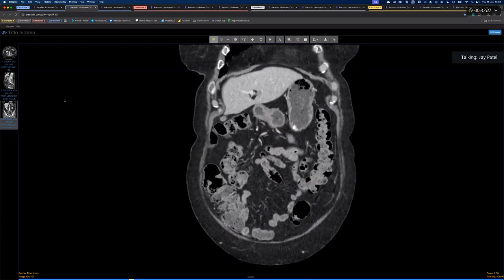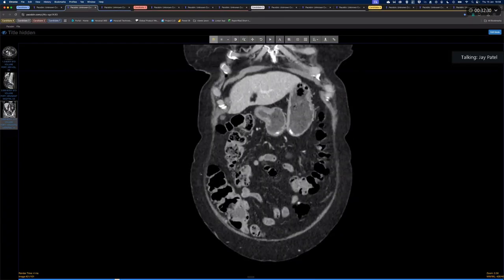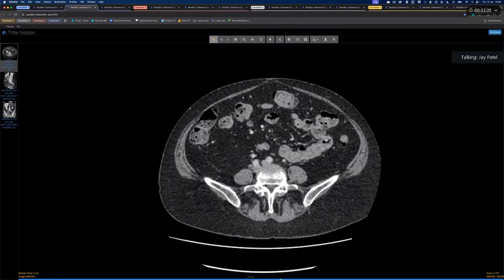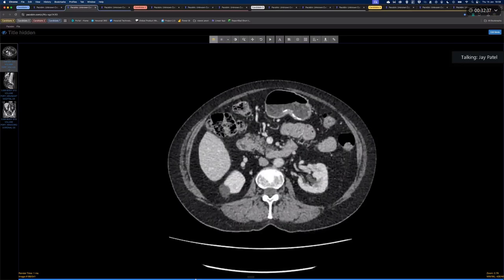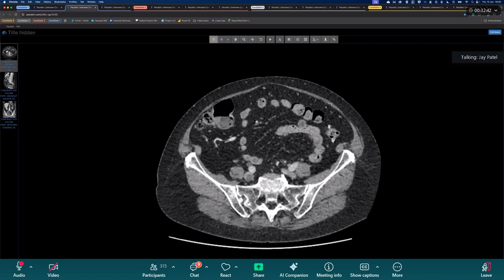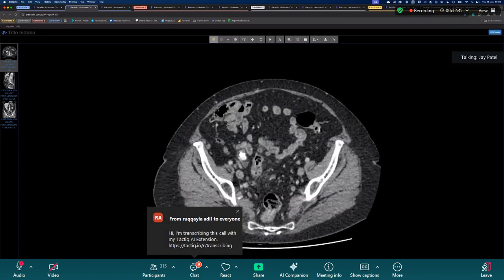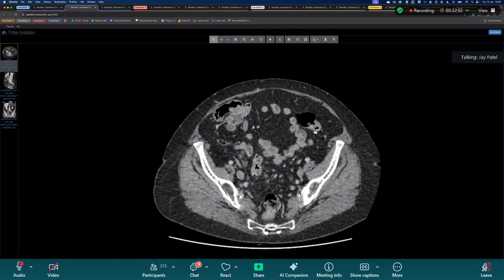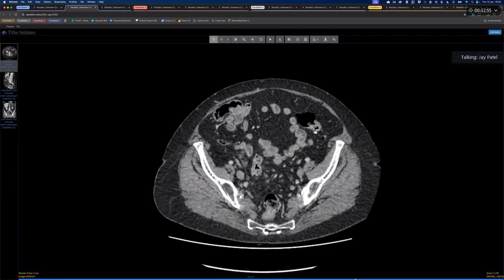Now, just as a quick tip, people sometimes get confused looking at the bowel in the bottom right corner of the tummy. A very, very quick way of identifying where the cecum is, is identifying where the ileocecal valve is. And a very quick way of identifying the ileocecal valve is the blob of fat. It takes seconds and is nearly always there. It's quite unusual to have a completely fatless ileocecal valve. So when you see this, it's always the valve.